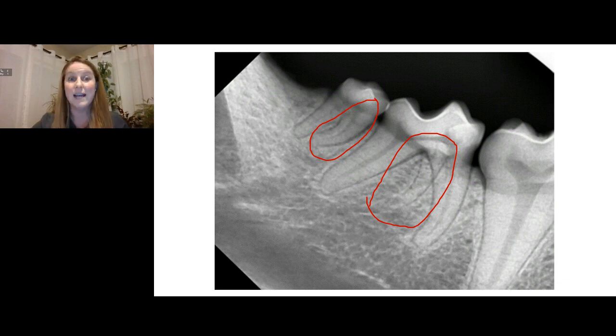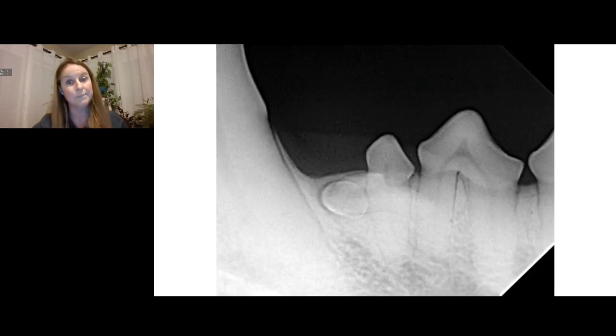If they're not causing any amount of bone loss or crowding or other problems, you don't have to take out those teeth just because you see those. You just want to make sure that you are marking those down in your records so that you know about them. Why do they matter? Well, you want to make sure you have these radiographs if you do have to take out those teeth, because it's not really very good if you leave a root behind because you didn't know it even existed.